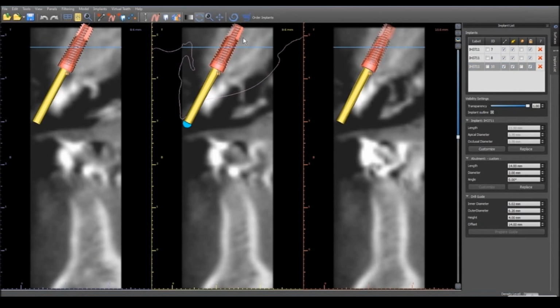And number 10. So the patient had a reasonably wide ridge. The challenge on this case actually was to get the implants as buccal as possible. I'll show you that when we look at the ridge. But you can see that in a case like this, it was quite easy, without a wax up, using the flipper as future tooth position.